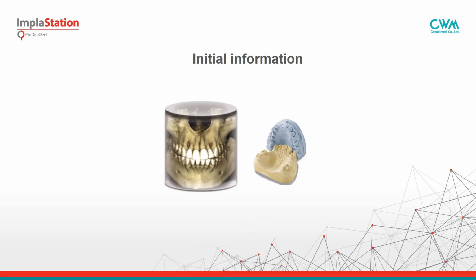Let me say some words about initial information just to avoid a false start. Usually for guided surgery we need information from the CBCT and a digital jaw surface, like a digital object. It may be an intraoral scan, it may be a plaster model scanned in the laboratory scanner. So these two scans we have to provide to the technician for planning or use for planning by ourselves.